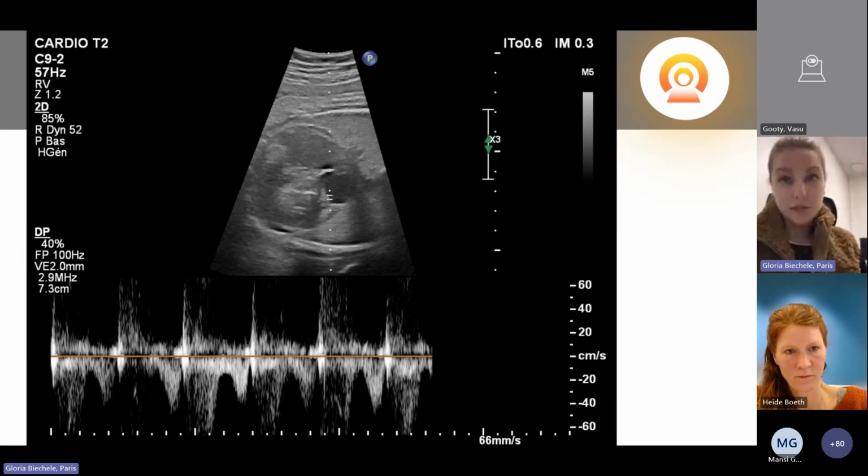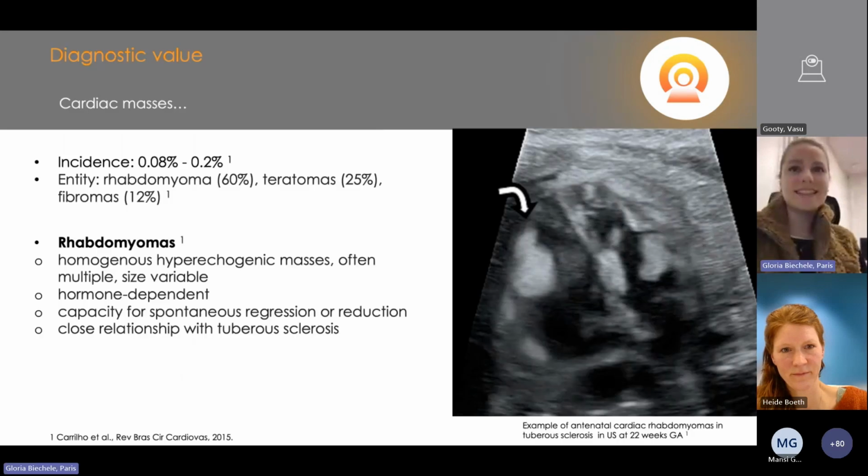To sum up, this confirmed the recent data of the voluminous left ventricular tumor, limiting mitral opening kinematics and considerably reducing the ejection pathway, with a retrograde flow of the arterial duct and a small lamina of pericardial effusion. However, in the MRI we saw a homogeneous mass, while the signal in ultrasound was clearly heterogeneous. And so I would like to follow this with a little excursion on cardiac masses.